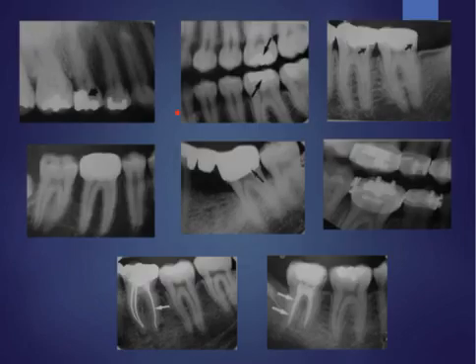In the radiograph, what you see here is restorative material, mainly amalgam. Here also you can see a restorative material. In the third radiograph, you see a small extension radiopacity, which is called a pin retained restoration. For extra retention, in some cases with a very heavy filling, you drill a hole into the dentine and put a pin into the dentine. That is called a pin retained restoration.